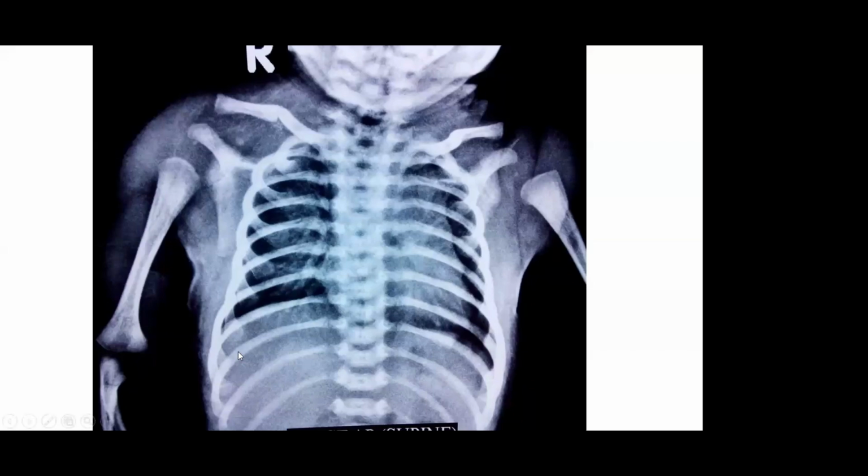You see the stark difference between the lung parenchyma and whatever vascular marking is there, and between the vascular markings, lung parenchyma and the bones. When there is such a stark difference, it is nothing but a problem with the contrast adjustment. It is more or less how the post-processing happened. You need to tell your radiographer that you need to reduce the contrast, and many of the PACS systems do have an adjustment for contrast.